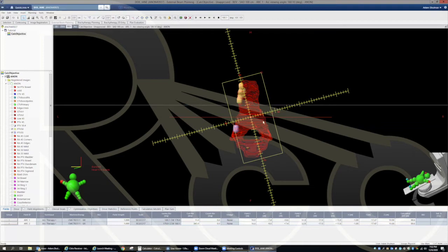So for example, for this pelvis plus periaortic, you'd want to ask the doctor what sort of imaging and where. So in this case, the doctor was interested in the bowel loops up here, right? We showed that bowel loop that came close to this PTV-50. So they wanted a CBCT up here to look and see if the bowel loop stuck during surgery or after surgery, if it got attached, or if it was moving some, and they could see that by imaging day to day.